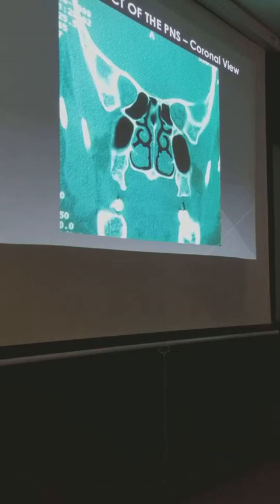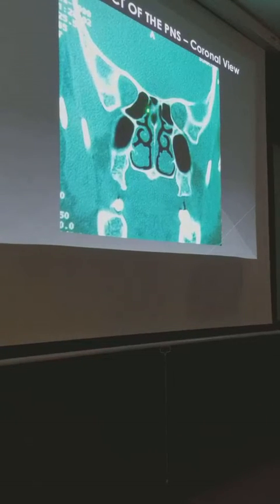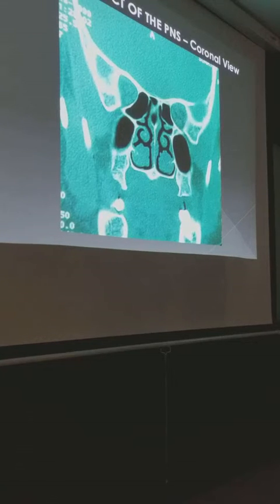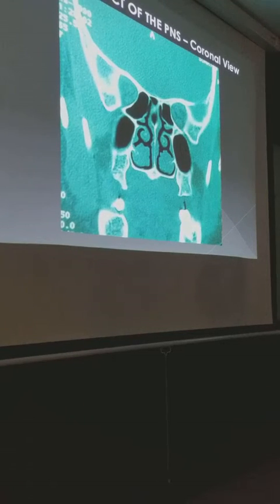So I have to stay medial to it, okay? So that's the problem. It's hard to say, are we dealing here with a large sphenoid on the right and a small sphenoid on the left, or are we dealing with an Onodi cell? Okay. That's why I included two axial views. So we can explain it much better later on. Next slide. Next slide, please.